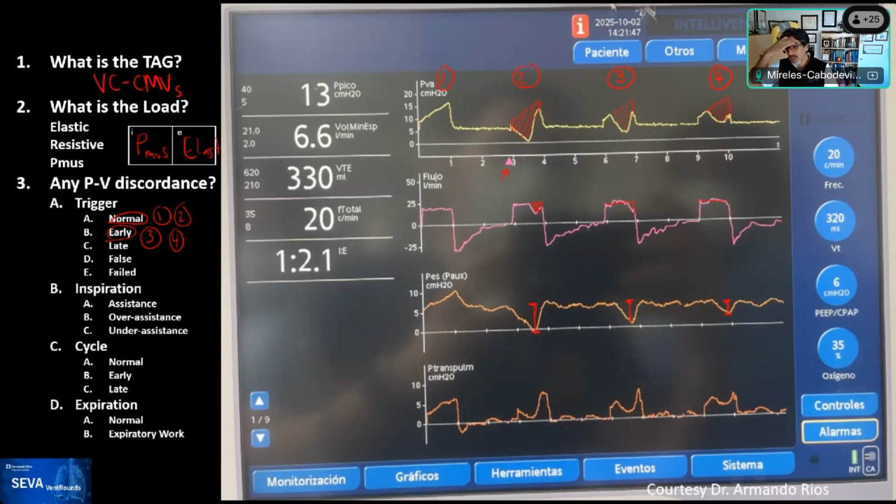and you can see how different it looks. And I find this appealing mentally, because many times we see the waveform up here, and you realize then how this tells you about the work shifting that is occurring on this breath, and it's complementary in this case with the esophageal balloon. It also helps me understand, I mean, you heard us say several times about work shifting, that the severe form, when you're generating negative pressure, and actually this one goes almost below, but it's dropping the pressure below the baseline. So the patient is getting less flow than it should for what the patient wants.